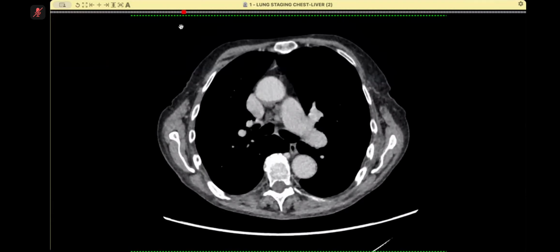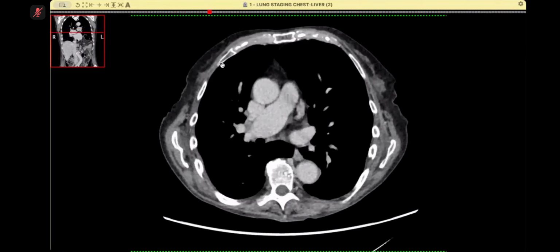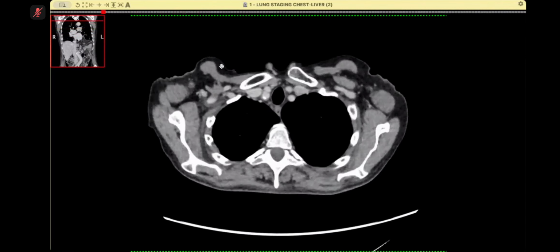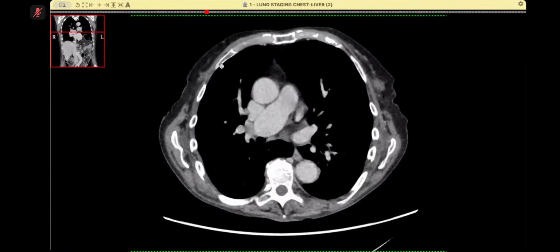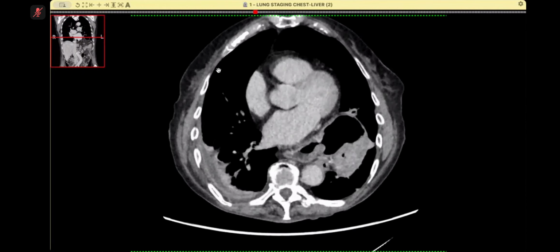So I'm provided with the CT chest. Sir, I don't have the control to scroll. Okay, and please remember now, candidates, whoever becomes a volunteer, you have to learn before and ask your colleagues how to ask for the mouse. Now I'm showing you. Just concentrate on the right side of the chest.